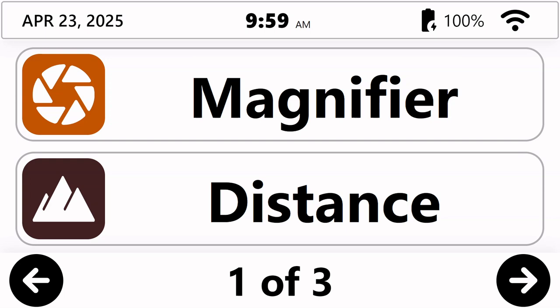In this video, I'm going to show you about the distance application in your Prodigy for Windows software, as well as some new features that we've added with the version 1.3 release of the software. And these will apply back to other older videos, so you'll be a little bit ahead of the game there.